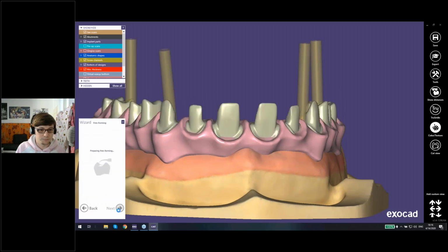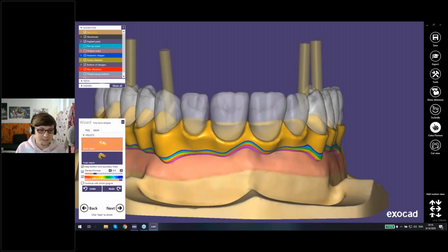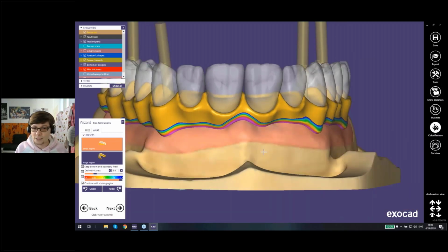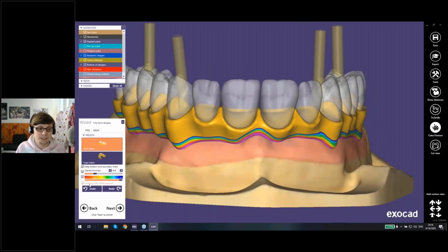Oh, yeah. Here in your freeforming for your gingiva, it's two steps before, I completely forgot it. You have here the option to continue with shrink gingiva. You can also select this in expert mode. That's why I thought of this right now. In the past, you always had to select it in expert mode. But since Plovdiv, after freeforming your gingiva, you have this option here right away to activate it.